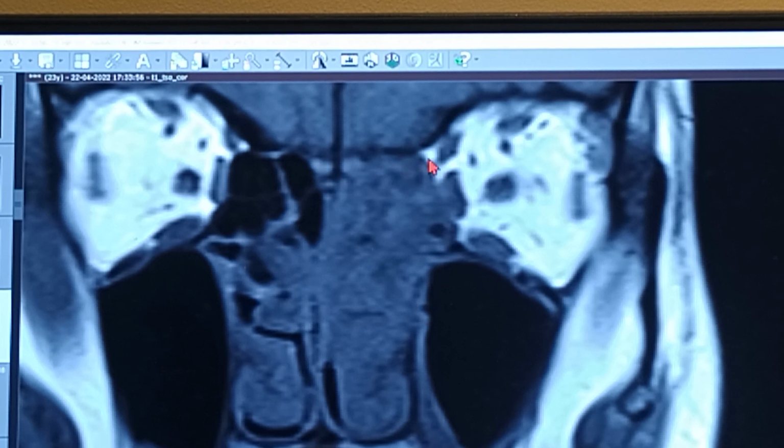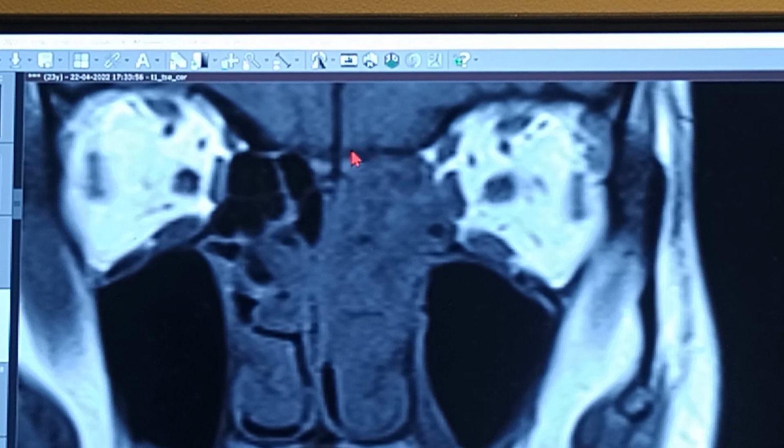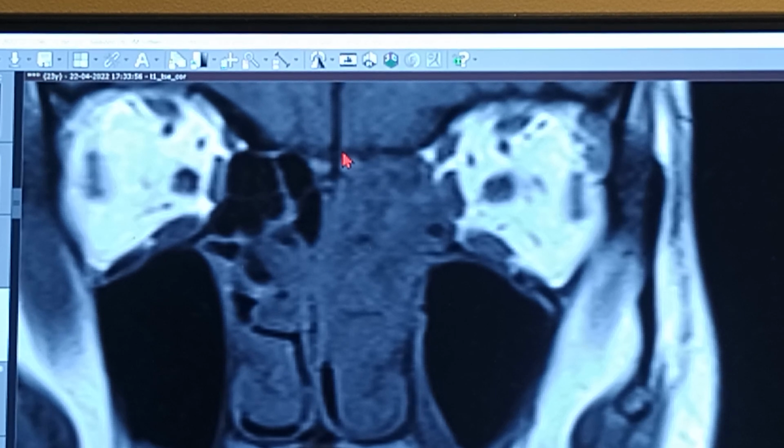So the anterior ethmoidal artery breaches the lamina, goes out of the lamina, enters and travels along the skull base, enters into the nasal cavity and the skull base over here, and eventually enters the septum and the dorsum of the nose. It also supplies intracranially, it goes above superiorly. I also have done a video of the entire course of the anterior ethmoidal artery. You can have a look.